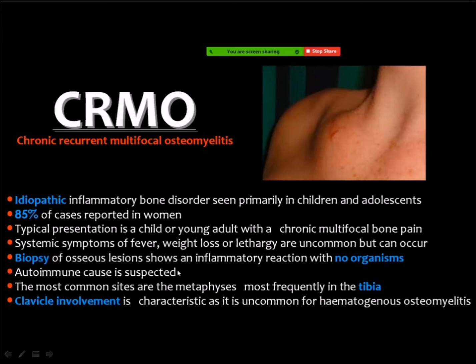The typical presentation is one of the sites that are very well demonstrated in this disease is the clavicle, and you got the clavicle involvement, which is expanded, and sometimes you got a periosteal reaction, and hence you may think of this if you see the clavicle.